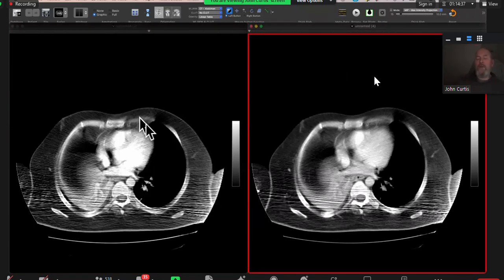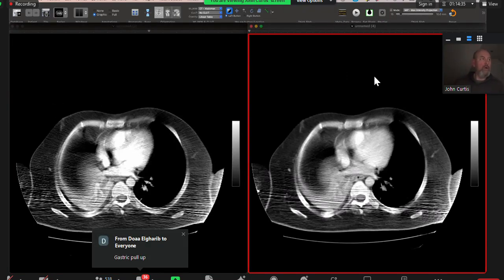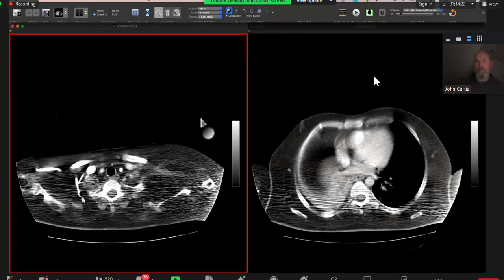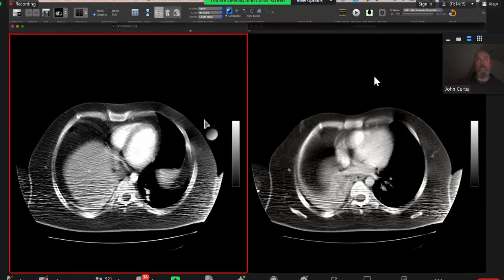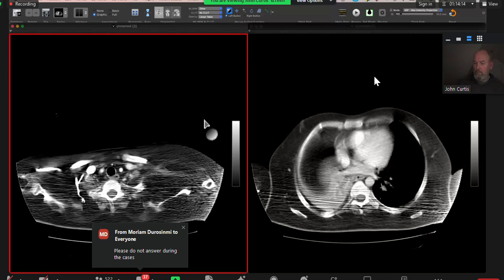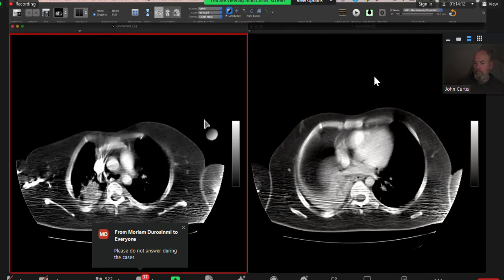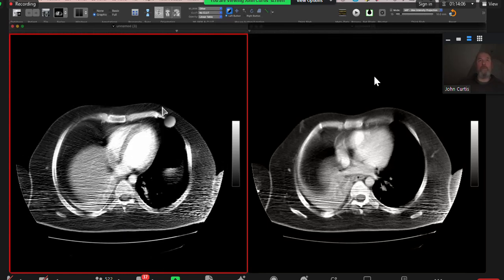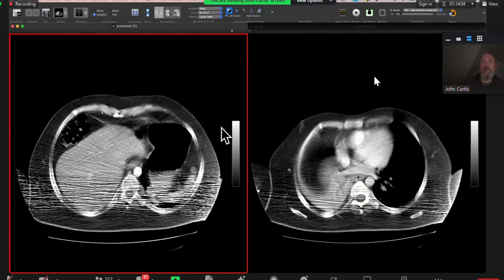Okay, so this is a 25-year-old male who has been on ITU 4 times with respiratory failure. 25. Okay. Just going to scroll for my findings. It seems to be jumping. Do you want me to scroll for you? Yes, please. I'll do that for you. Don't worry.